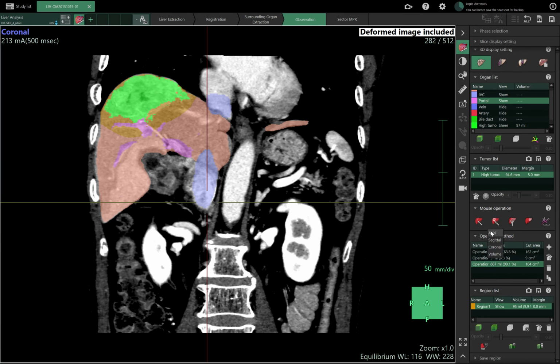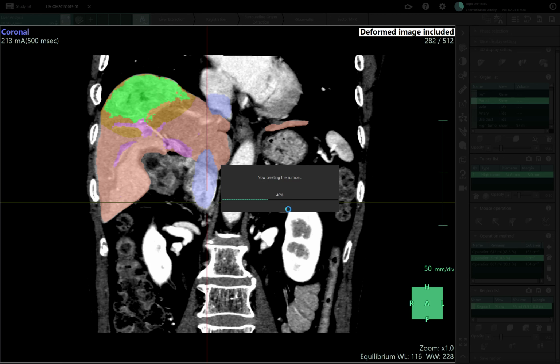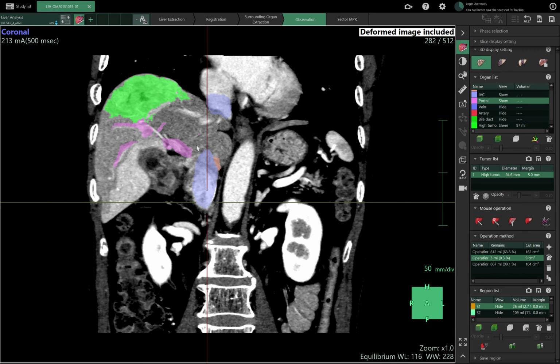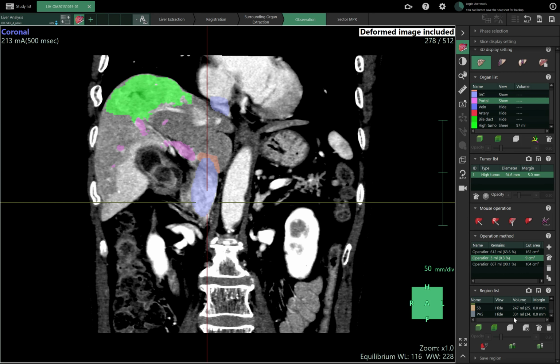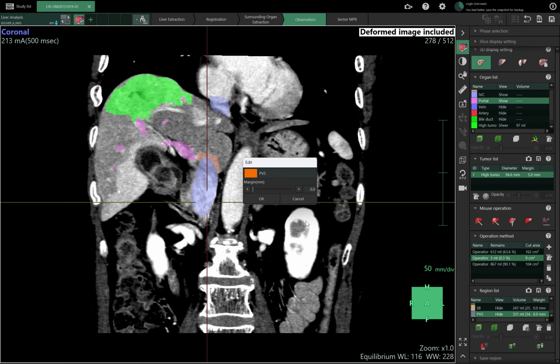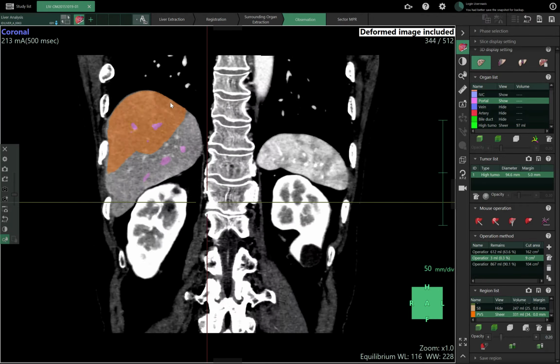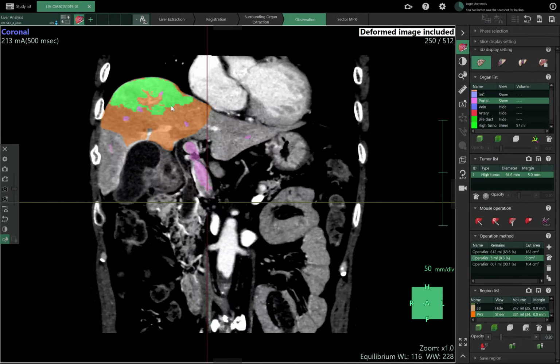The good thing with this is that sometimes I have different extractions, for example here, extraction 8. I will change the color here, because otherwise gray is not visible. So I will edit here and change the color to something brighter, let's say orange. Okay, make it translucent. It's here. So this is my automatically created region with segment 8 and 4A.